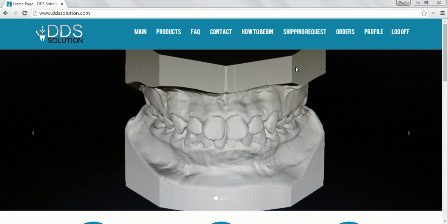Welcome to part 2 of the DDS solution tutorial. In this part of the tutorial, I will be showing you how to download your completed study models to your computer and subsequently view them and be able to take measurements, manipulate them, etc.